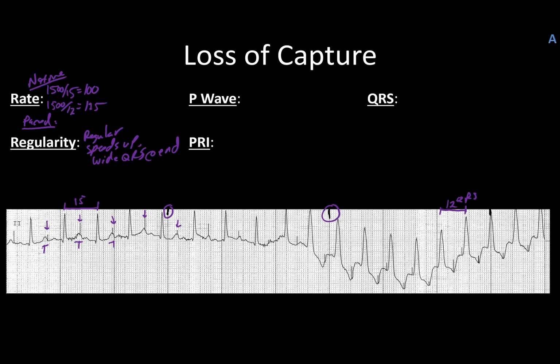And that makes things really challenging, at least at the start. You'll notice that we do have P waves pretty much always that you can see occur prior to the QRS. And so it raises the question of, does that pacer spike really have anything to do with anything whatsoever, or is it just there? And so that's where you start thinking about, is it a loss of capture?